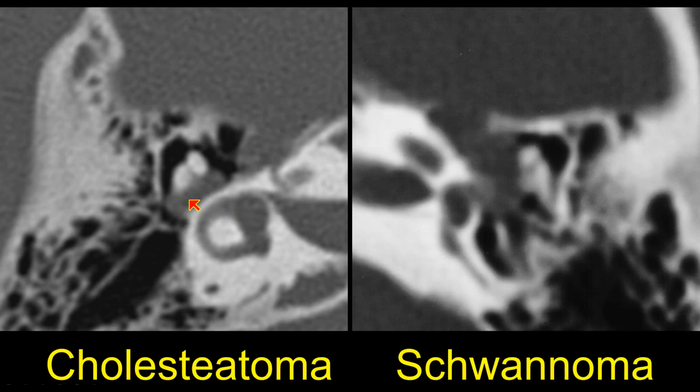So this case is a cholesteatoma that's destroying the ossicles, which we often see with a cholesteatoma with some kind of osseous destruction, whereas this case that was actually a facial nerve schwannoma is pushing the ossicles out laterally without destroying them. So a cholesteatoma is more likely to destroy the anatomy next to it than a schwannoma is, a benign nerve sheath tumor.